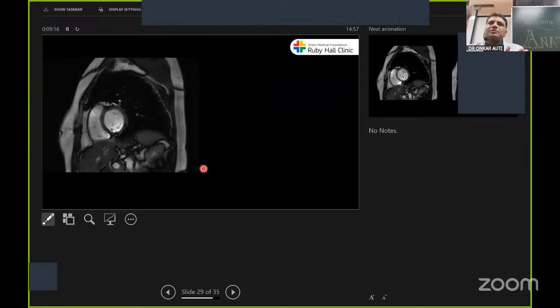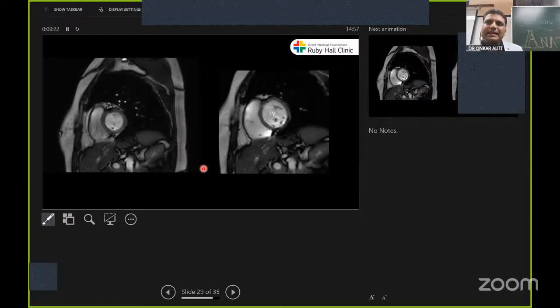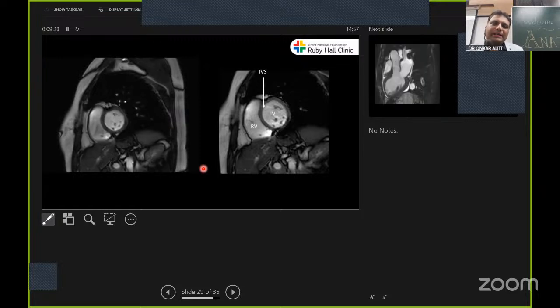Okay. So this is the short axis image. When you cut across both the ventricles, you will get this image. Okay. So in this image, this is the LV and this is the RV. Again, the wall in between both ventricles is called the interventricular septum. Can somebody tell what are these structures over here? These 2 points. Papillary muscles. Yes, as we saw on that CT image, that there are two prominent bulky papillary muscles in the LV.